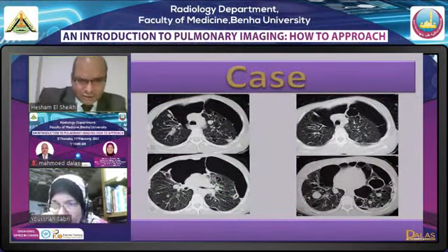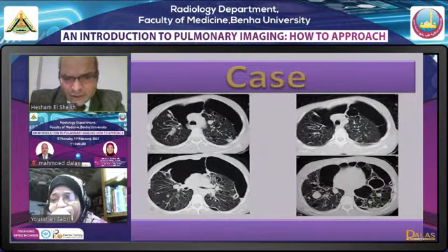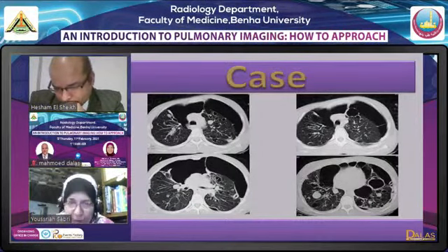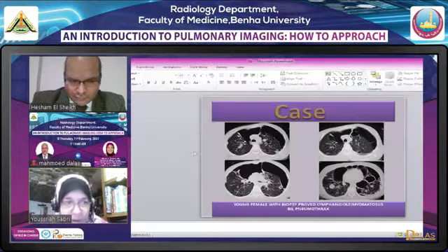Another question: how to suspect atypical infection on I think this an X-ray or CT atypical infection. طيب هوريكم حضرتك، هرجع لحاله هنا كده وهقول لحضرتك امتى consider atypical. Let us see here.